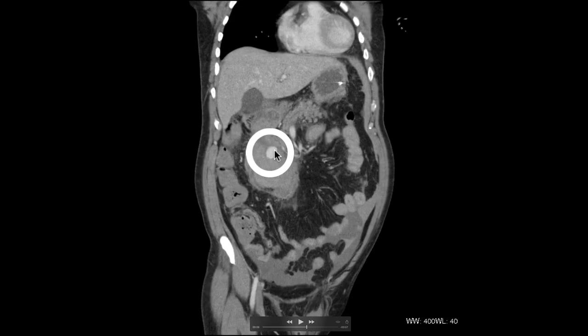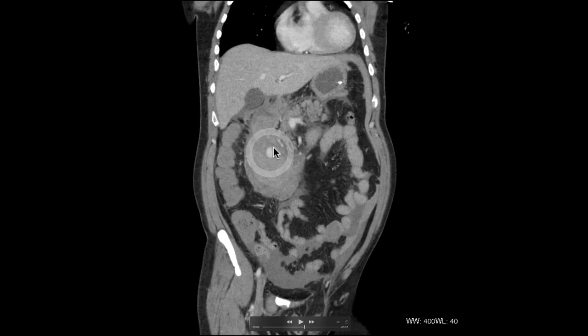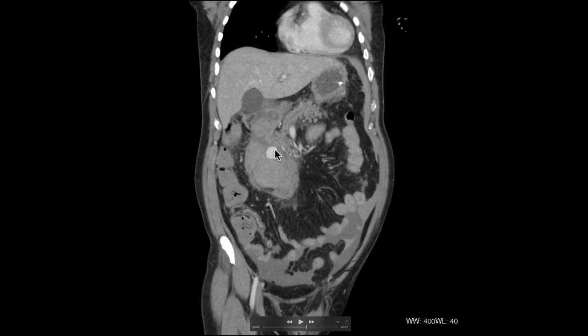And this patient has got this big blob here. You can see that's the same kind of attenuation as the blood vessels. So this is contrast that's just been injected, sitting in a little pseudoaneurysm. And around that you can see all this stuff here, and this is haematoma, this is blood. Blood on a CT, again, is a bit brighter than normal fluid, normally about 60 to 80 Hounsfield units.